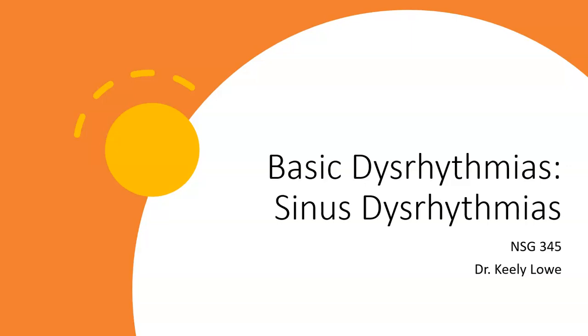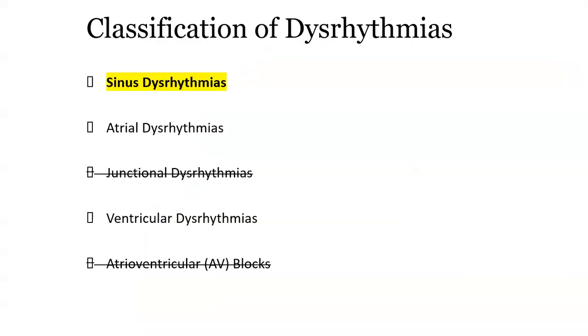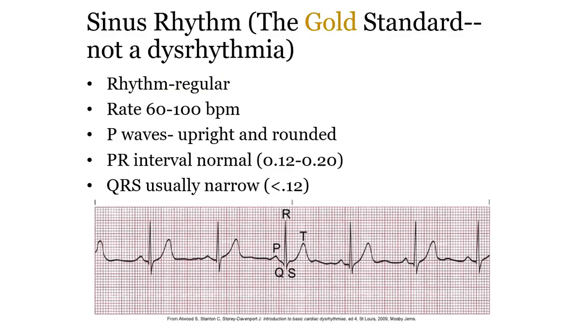We've looked at how to interpret a basic EKG strip, so let's start looking at some dysrhythmias. In this video, we're going to be looking at dysrhythmias considered sinus dysrhythmias. So remember, we are talking about our gold standard as a comparison, our sinus rhythm.